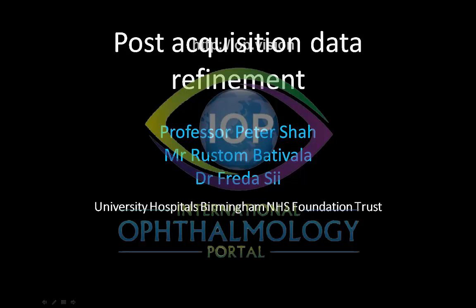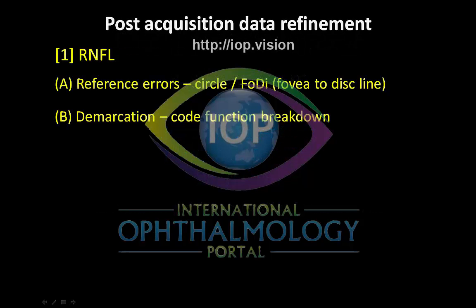Like any data, post-acquisition data refinement is critical. And this talk actually looks at how you should be thinking about the data that you're given for glaucoma OCT. So post-acquisition data refinement, first of all, we could consider the retinal nerve fiber layer scans.